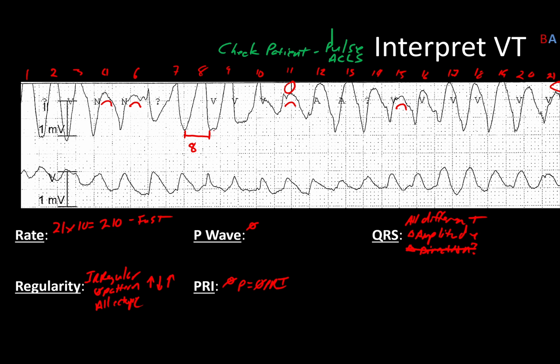However, I've got this little space here, and then I've got another one that's 6 across. If we argue that right here is maybe the start point, I measure from here, it goes down, it comes up, I've got a bit of a J point here, that's 8. Really difficult to sell that one as well.